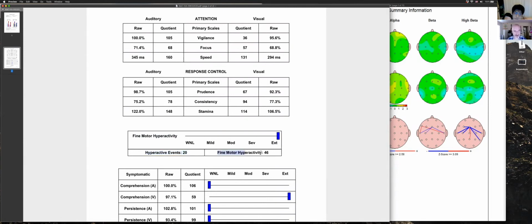And then this fine motor score down here is about what's happening between the trials. So we're watching for fidgets and movement, which isn't scored, but I can tell you we're holding really still. Most adults are performing about 100 to 150 fidgets across the 400 trials. And you only did 46, which means you're holding very, very still, trying not to be impulsive, and you still were impulsive in the extreme range. So it's a brittleness. You're trying to control, but failing to control.